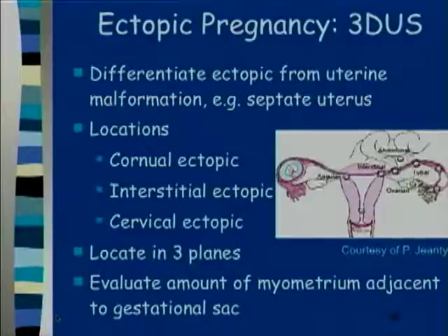Now, I'd just like to finish talking just a tiny bit about early pregnancies, and particularly ectopic pregnancies, where I think 3D ultrasound can be incredibly helpful.